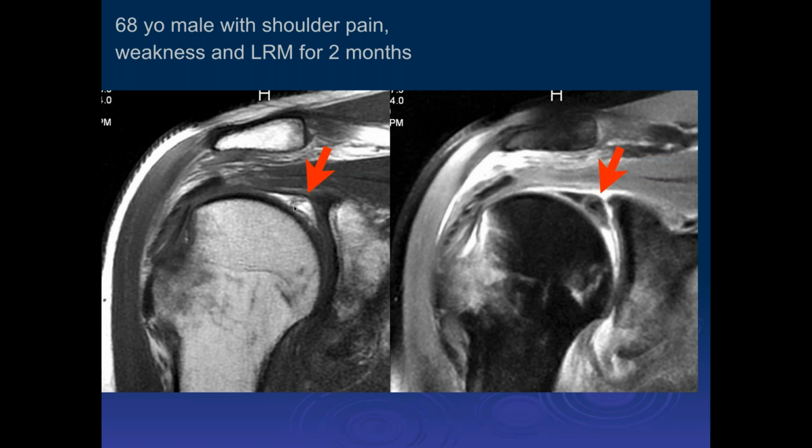Well, what's this? Oh, is it? It's like bone actually. There's bony. No, I think it's fat. Okay. So what's fat doing there? Okay, and then what's happening down here? So there is fracture of the inferior glenoid as well. Okay, so what do you think could be the mechanism of injury that would produce these bone injuries?